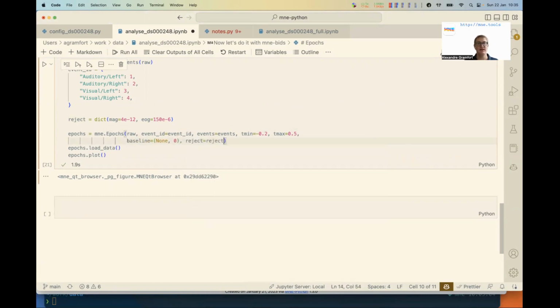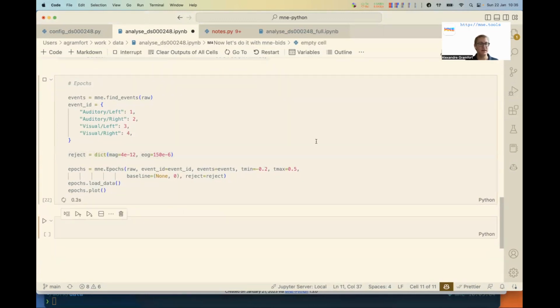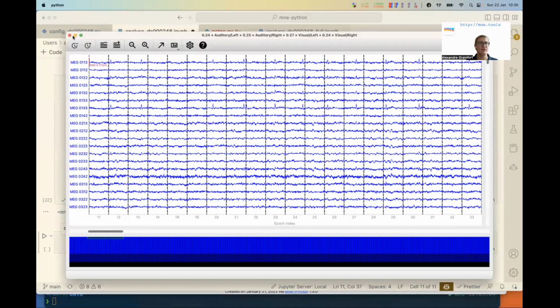Reject equal reject. Let's do this. So now I'm going to reject. So you should see that the strong artifact is gone.